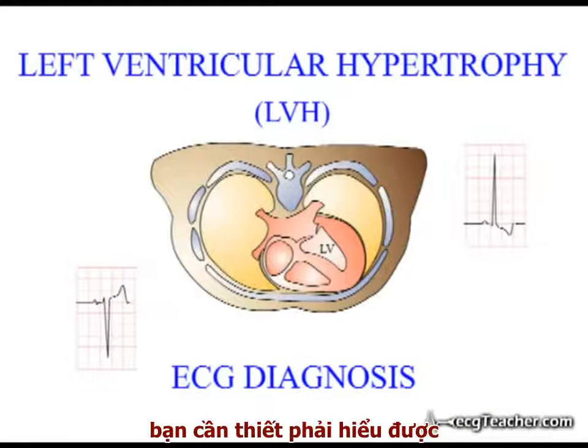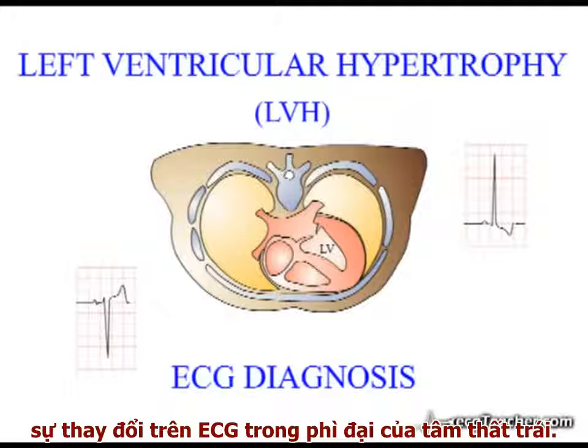For these reasons, you need to ensure that you understand and are able to recognize the ECG changes resulting from hypertrophy of the left ventricle.